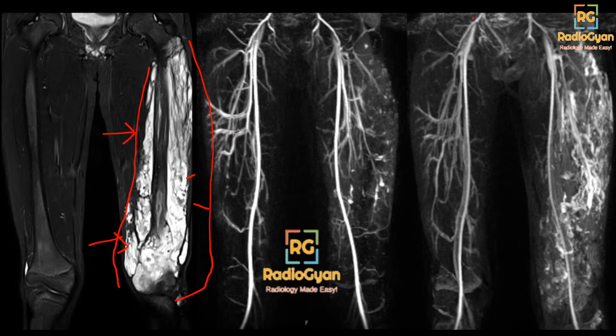The ideal sequence would be, so apart from a radiograph, what sequence on MR would you look for phleboliths on? What sequence is preferred? The same sequence you'll use to look for loose bodies on, say, a knee MRI in an osteoarthritic patient.